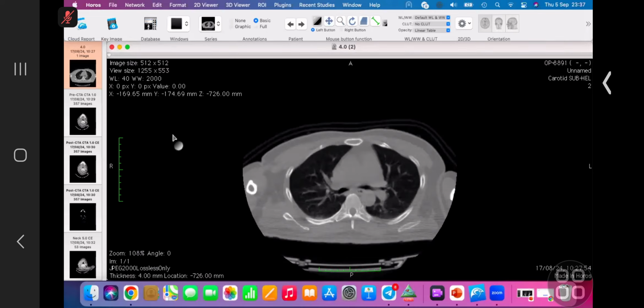Yes, okay, sir. This is your case, candidate 2. This patient came with a history of jaw pain, sorry, facial pain, and we did a CT. So, request control. Can you send a request to control so that you can take this case and scroll by yourself?